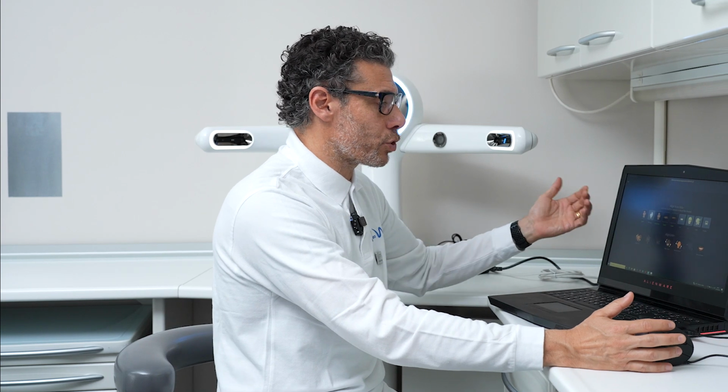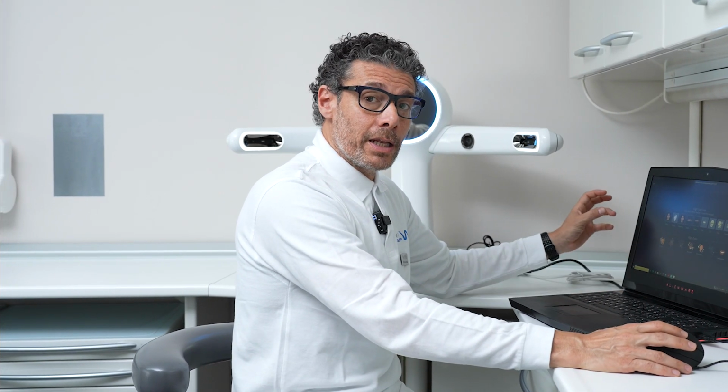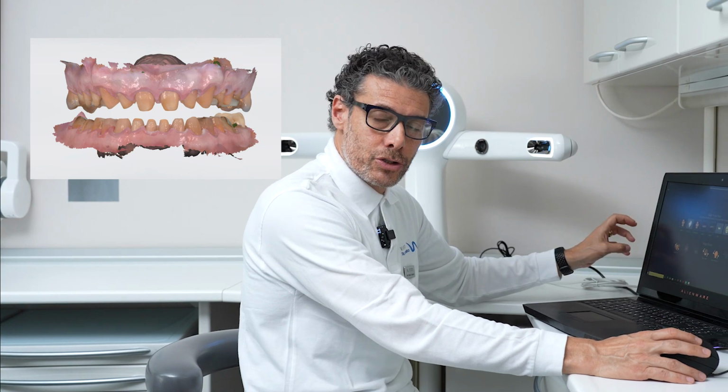In cases where we are rehabilitating a complex case and not just using a single scan, as I am showing you here, I would like to inform you that in a natural teeth prosthetic case, the RayFace will retrieve scans with prepared teeth from the Communicate cloud.